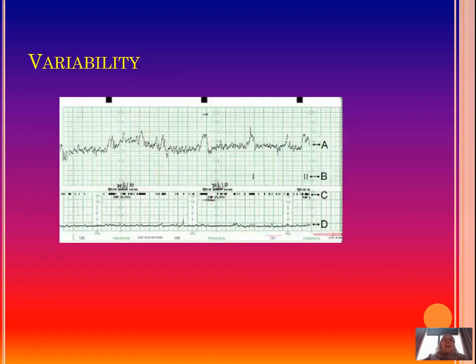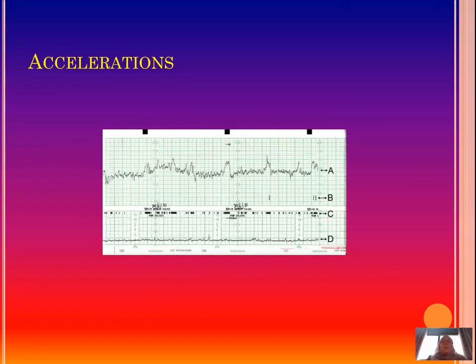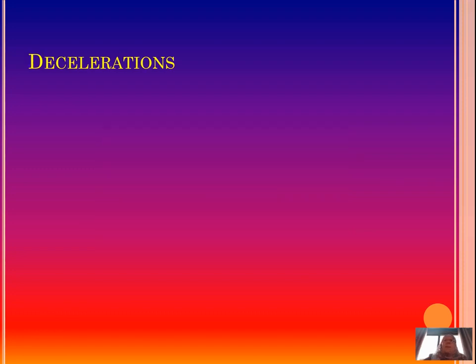Here you can see accelerations on the CTG. In the middle of the CTG you can see a fine looking acceleration followed about 4 minutes later by another one, and then 5 minutes later by another one. These are very good features.